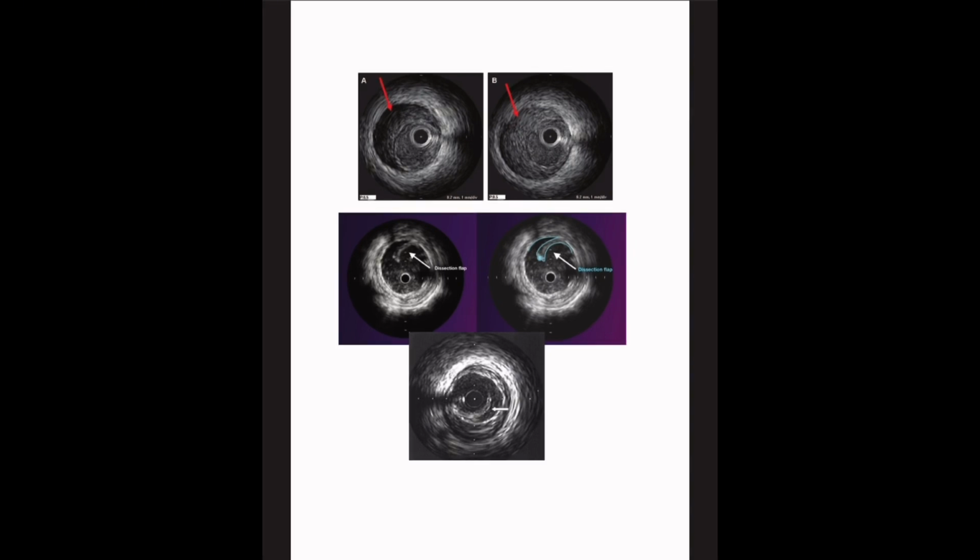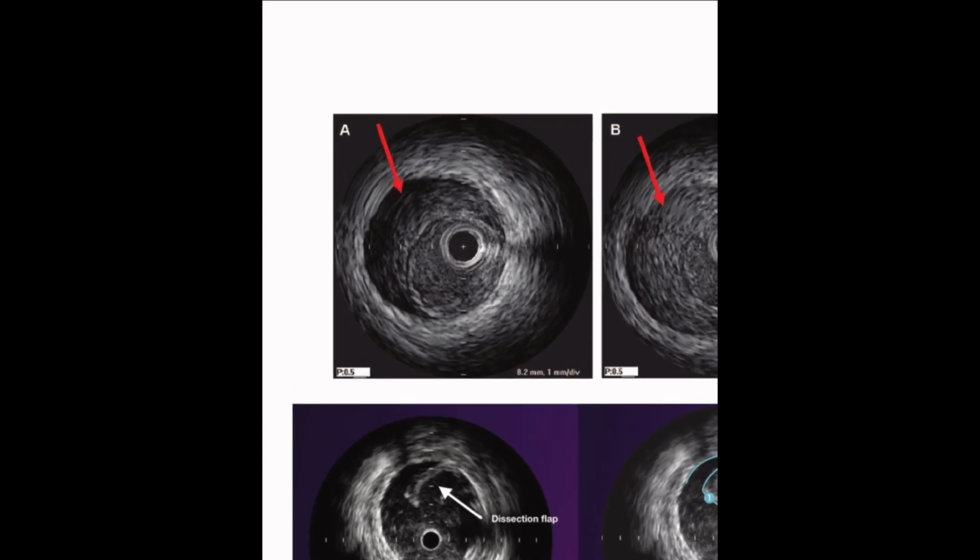Okay, so you wanted examples of perforation and then of dissection. Well, really with a perforation, you aren't IVUSing unless you're checking that it's sealed, and you're going to confirm that with angiography first, because putting this type of equipment down there, if you think there's perforation, actually risks making the perforation worse. So you can use it after, to check for a seal and that there are no residual dissections, but you really hopefully aren't going to be using that in that case.